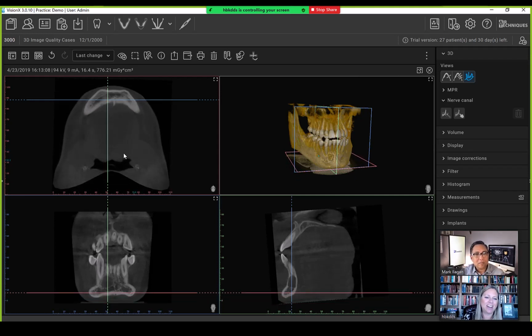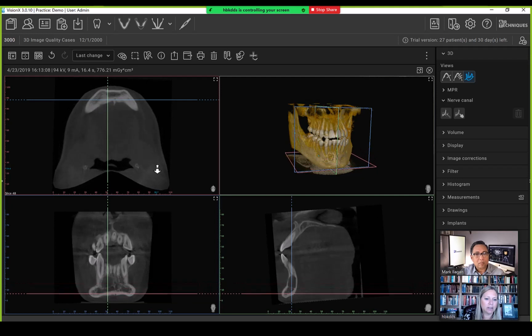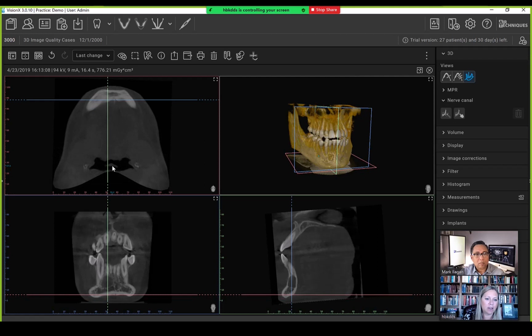And then I'll come up looking at my airway space. And of course, it looks like these are our little hyoid bones right here. You can see that very nicely. We just got a touch of them. We can see the epiglottis right there. So we know we're about the C3, C4 level. You can base that off of the fact that we see the hyoid bone. Even if you don't see your cervical spine, you know what level you're at.